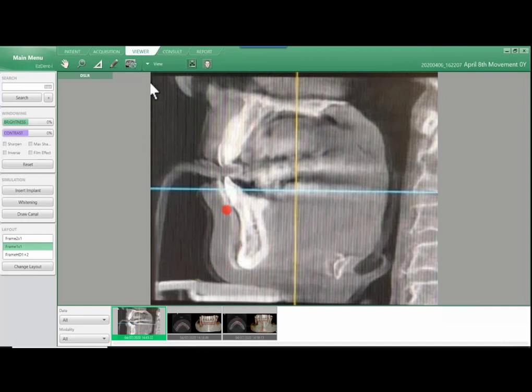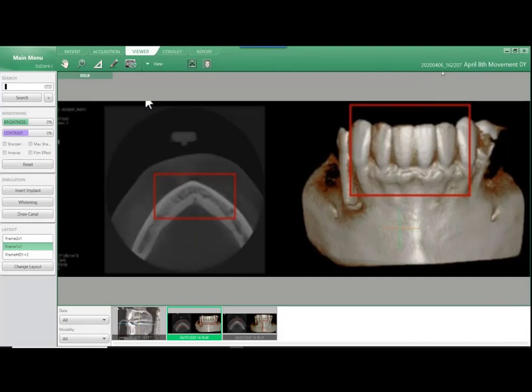I can see here the mandible, and I can see another border of the mandible. So that's really showing patient movement there. I'm going to look at my hyoid bone down here. We can see the reflection streaking off of that hyoid bone. And then lastly, my soft palate here, we can see a double image with that soft palate. So if you're seeing this, we really need to address patient movement, because the desired image we want is going to be this image here. If you have to get creative, we can have the patient sit in the chair. Remember, our scan time is either 4.9 or 5 seconds through a 9-second scan. This is usually going to be the scan time.